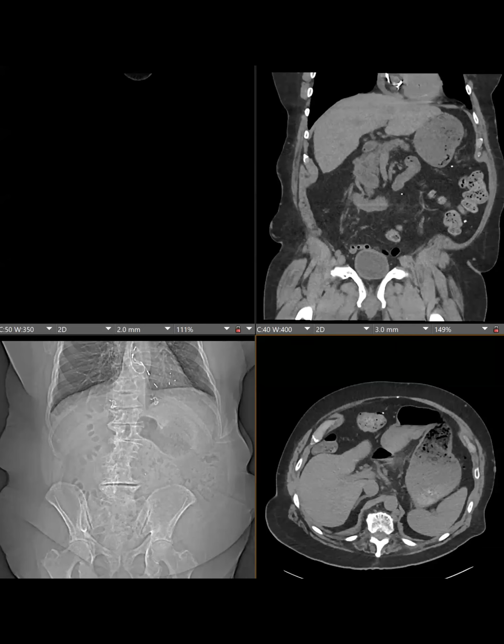So okay, and just one more thing. Anu had a good point in the chat. She said IPNBs cause both upstream and downstream ductal dilation, which is unique to an IPNB, which we probably wouldn't see with a cholangio. So that diffuse dilation of the CBD is the mucin filling it.